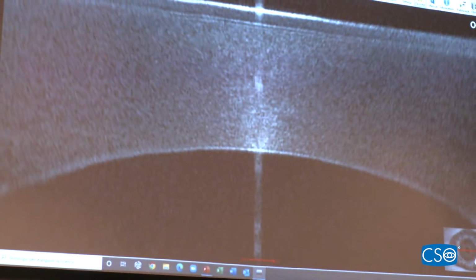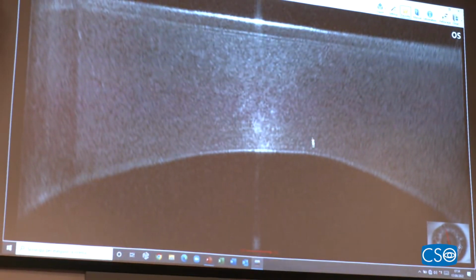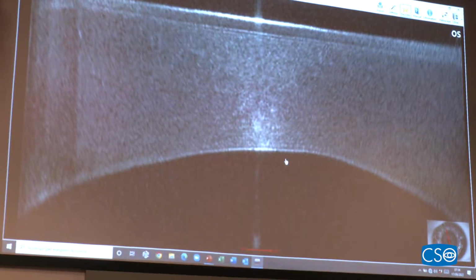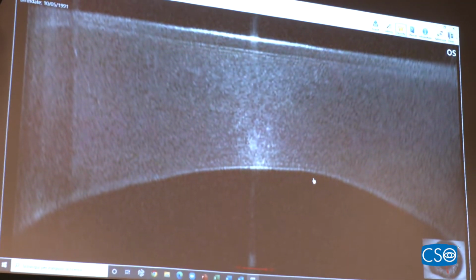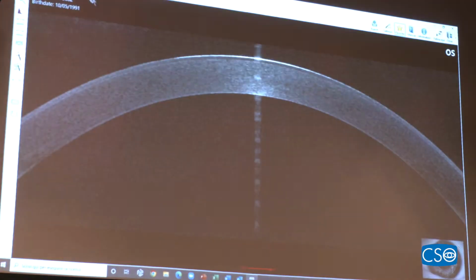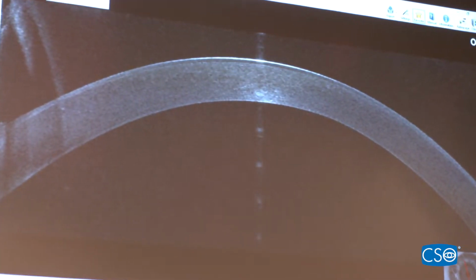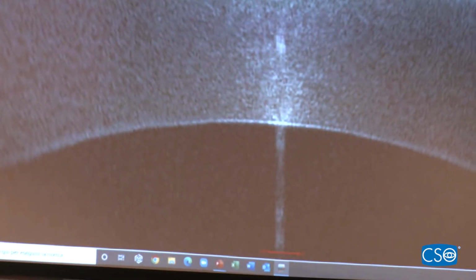So, for example, in this cornea, if I look at this axis down here, I can see the back surface is a little bit elevated here, yeah? Which you cannot see if you're looking at a section. So this is, if you like, a z-axis stretch plus a normalization of the second, third, fourth, and fifth surfaces to the anterior surface from a visual standpoint.